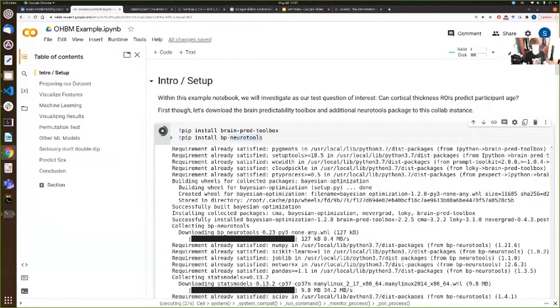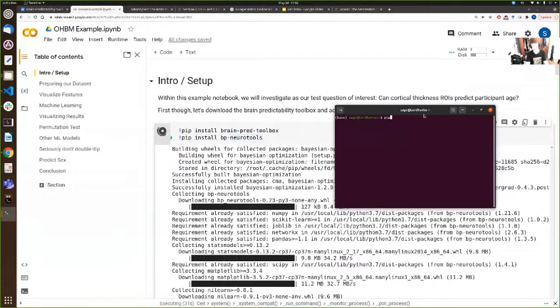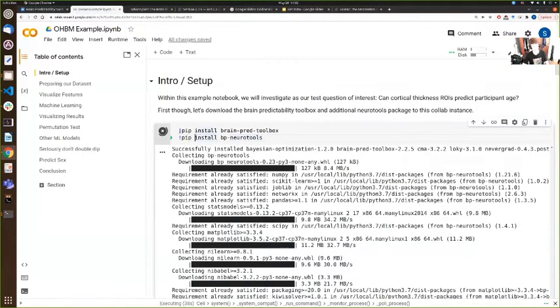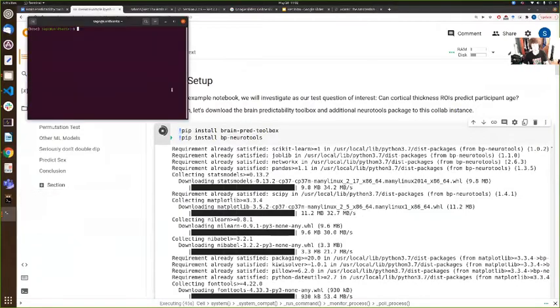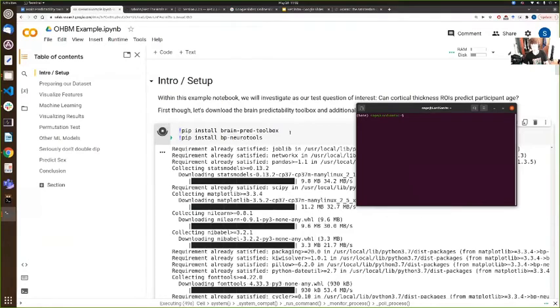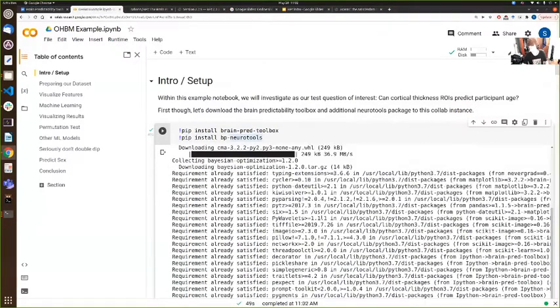Usually if you're installing this locally, you might run these pip commands from your terminal. But within these interactive IPython Google Colab notebooks, if you just add this exclamation point here, it's the same as running something from the command line. So all of these commands, you could translate locally by copying and pasting over. These are the two main libraries we'll use, but they also each contain a number of dependencies.